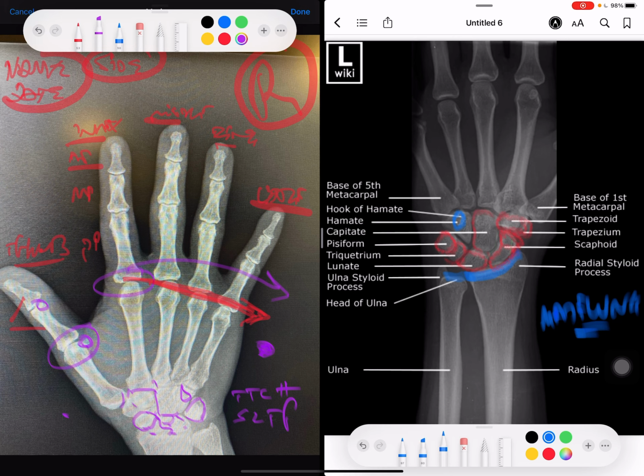So you look at fractures. On the second metacarpal, it may be an oblique fracture, but it looks like a line. But you always look for the height. If the height is short, and you see on this view whether the bone is rotated, it'll look smaller. This will be smaller than this width. Then you know it's rotated. If the widths are equal, you know it's not rotated and the fracture is non-displaced. But if the width is small, either proximally or distally, then you know it's rotated.